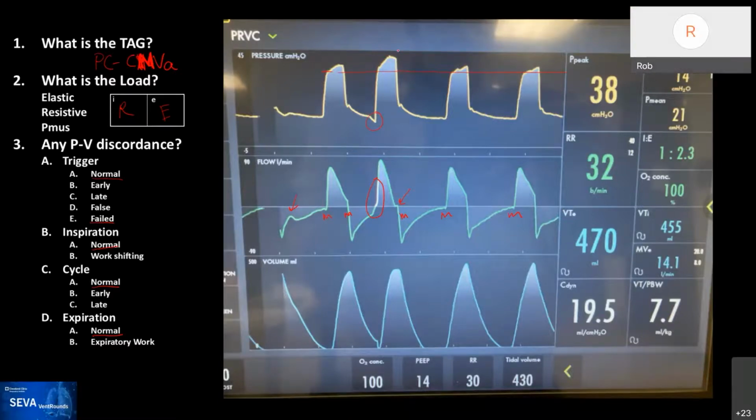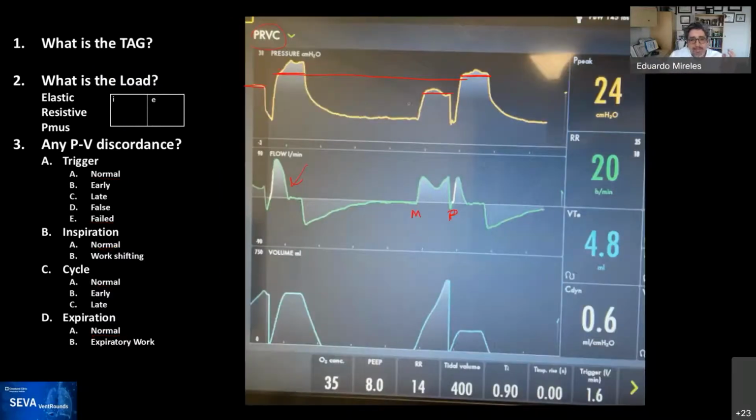This is a nuance of the mode, but you can see it happening here. It's the exact same behavior for these patients, and you can see that it just increases the pressure even though there's effort. It should be exactly the same amount of pressure as the prior breath, not higher.